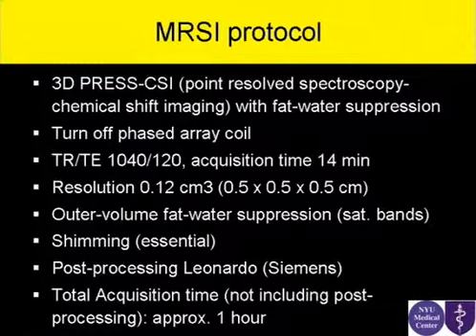You want to see the iliac vessels clean, basically to look for any nodes around the iliac vessels. So the optional sequences are spectroscopy and gadolinium. You can use gadolinium if you want, either using regular enhancement with 3 or 4 time points, or you can also use a perfusion type sequence where you can use multiple time points. That's what we're using in our department since recently.